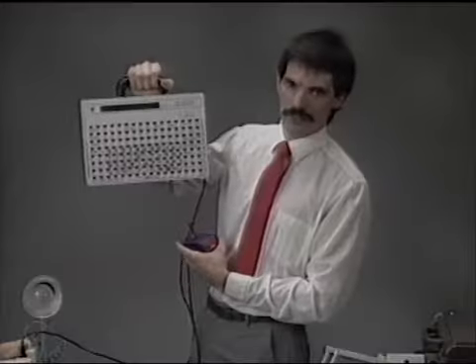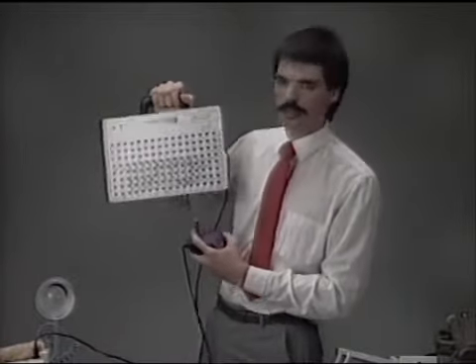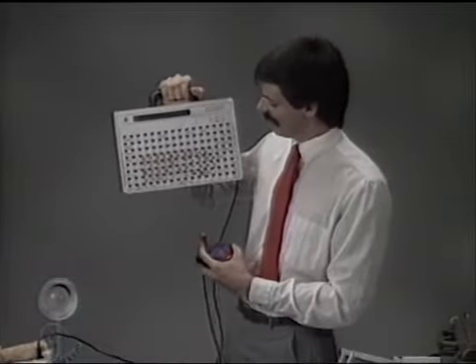I can tell you my name. And this is using a male synthesized voice. This particular one is called Smooth Talker. All of them have interesting different names.